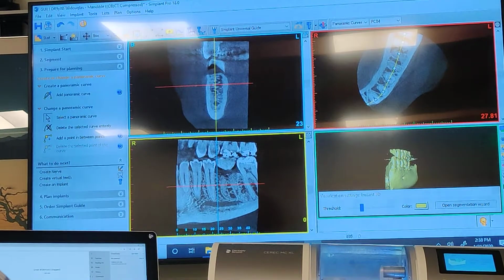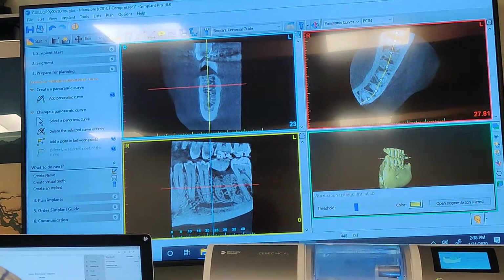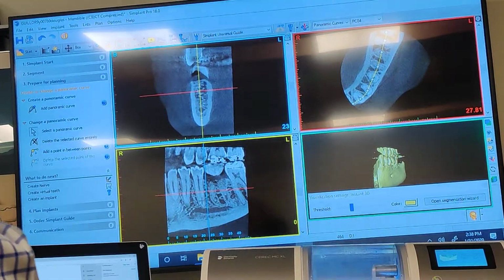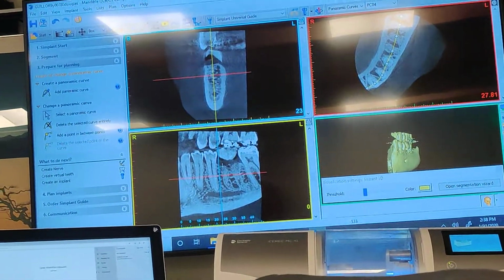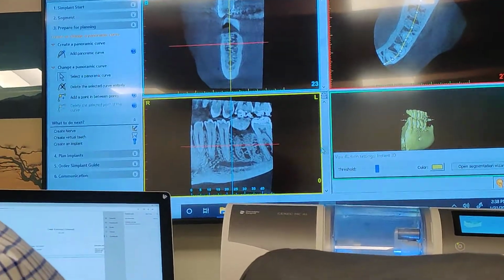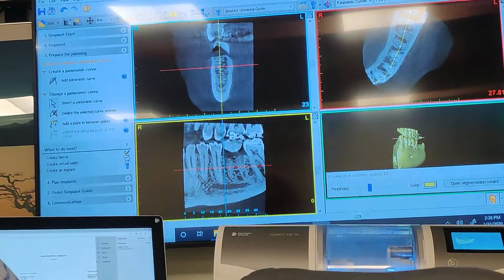Do you see how my green line, again, that's my knife, and do you see how it's parallel to that tooth? See, we don't want the knife and the tooth like this and the knife coming at it, okay? So we want our knife cutting through the bundt cake, which is the arch, flat, straight, right? Think about cake. Okay, so now this is, see the panoramic curve?